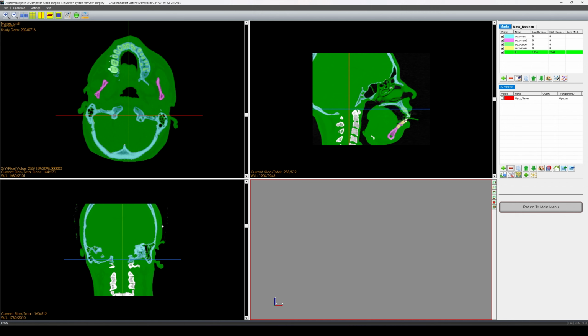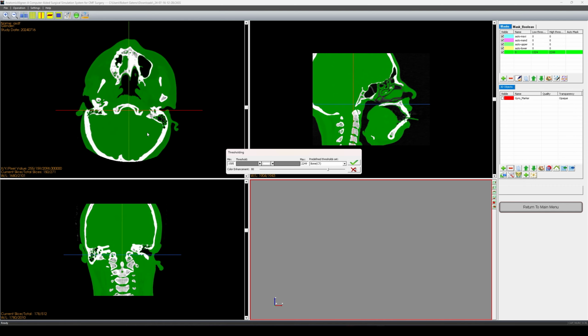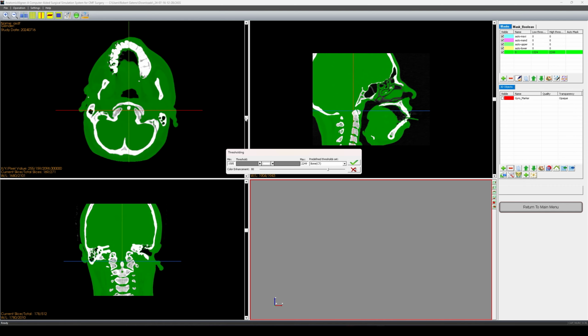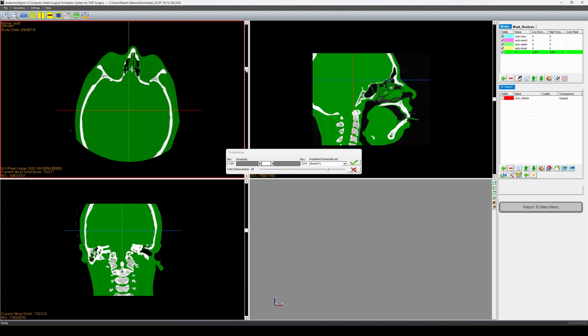So we're going to want to adjust that threshold one more time and tinker with it until that debris is unselected and we have a perfect selection of our soft tissue. See if we bring that slider in a little. We want to make sure we're not unselecting anything that actually is soft tissue. So we can slide through here. There's perhaps still some green right there, which is not soft tissue. If we move that over just a tad bit, we should be good.